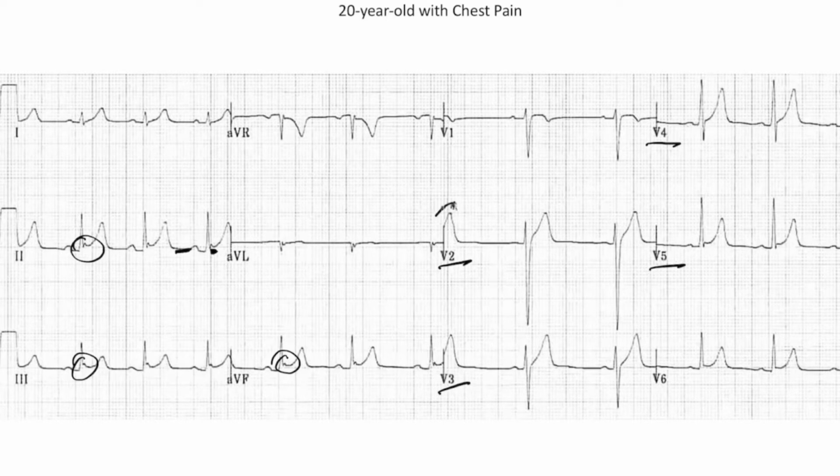Now, if you're wondering what this specific wave is, it's just the intersection between leads AVL and V2, and it doesn't really mean a whole lot. However, when you look at the TP segment and then the ST segment, the elevation is pretty obvious in the leads that we've just mentioned. In addition, notice that for the most part, the QRS complexes and the T waves are concordant, meaning they're pointing in the same direction. The findings that we see are typically seen in younger individuals and are called early repolarization changes.